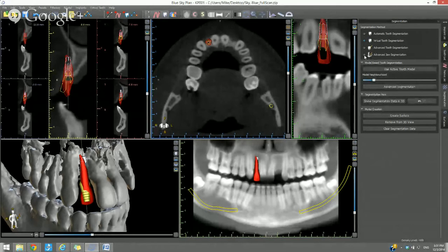Now, just a word about that. One of the reasons it's been very important, and something we've added recently, is if you want to fabricate a bone-supported surgical guide and the bone isn't dense or very thick, it's been in some ways a technological challenge, because you can't offset a bone that doesn't have a good definition in a surgical guide. Until now, it required somebody very experienced with CAD/CAM technology to fill in the bone and do all sorts of other things. We built the functionality into the software so it can be done just from Blue Sky, similar to any other guide designing or fabrication, and you don't need that high proficiency in CAD. You could use Blue Sky Plan to define and segment the bone, and then define the surgical guide. So that's another new feature that was recently added to the software.